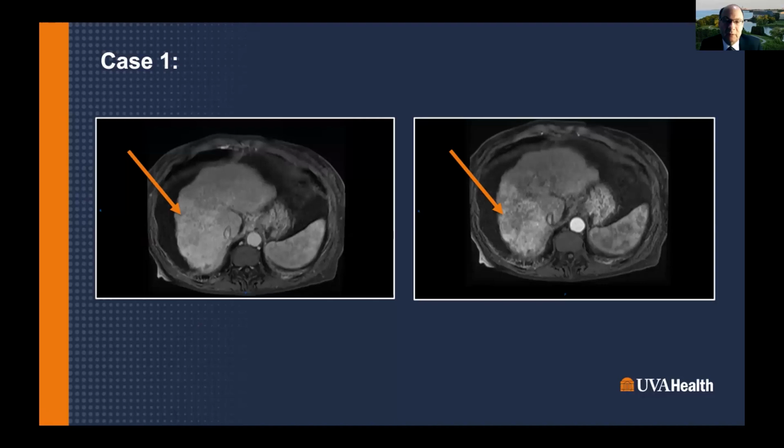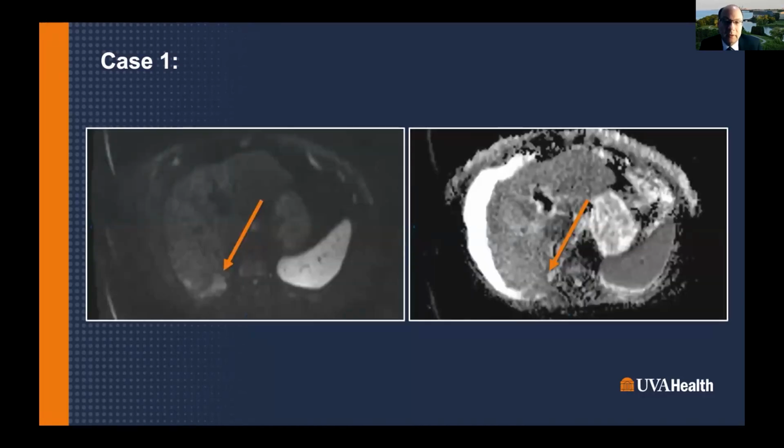And I've always been a big advocate of diffusion even before diffusion was popular, but here you could see that the only area with restricted diffusion is that small area. The other area, which clearly had restricted diffusion before, is not restricting, and it nicely illustrates, as you mentioned, even though it's not a huge part of LI-RADS, you have to look at the diffusion and you have to interpret it with, like you said, the ancillary features.